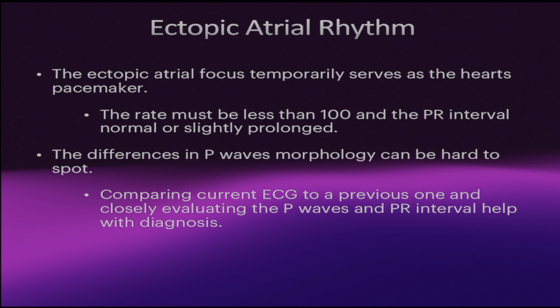If you have an inverted P wave in leads 2, 3, and AVF, that actually makes this a little bit easier to call it an ectopic rhythm, because your inverted P waves in 2, 3, and AVF really have two different causes.